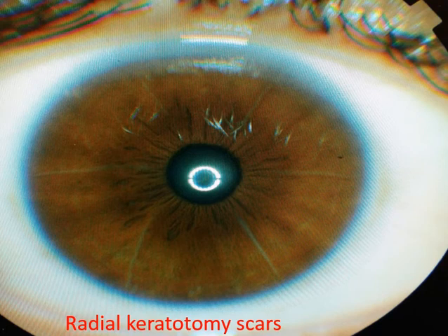So the appearance is of the linear opacities in the peripheral part of the cornea, which is going towards the pupil with no obvious signs of inflammation. These are radial keratotomy scars.